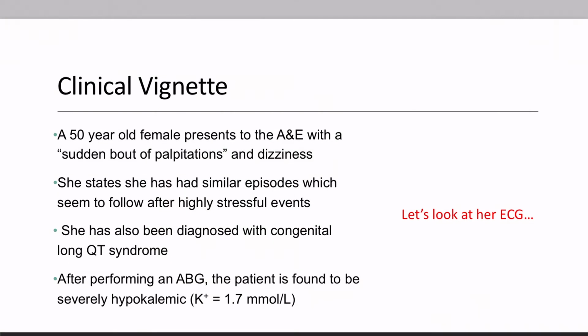Take a second here to pause the video and remind yourself of this week's clinical vignette. Now let's take a look at her ECG.